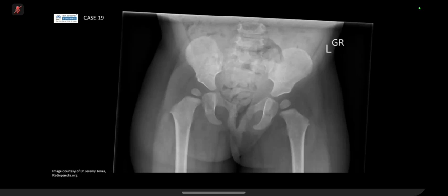It's a bit tilted, the pelvic X-ray, not well centralized. However, I will raise the suspicion of right-sided DDH. Yeah, well done. Yep, correct. So all the key salient features I mentioned.